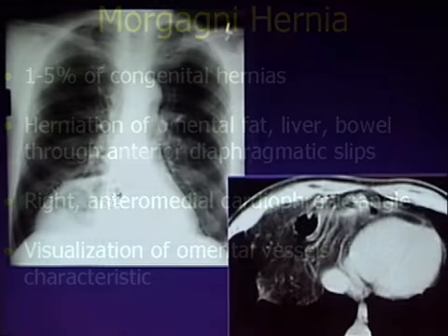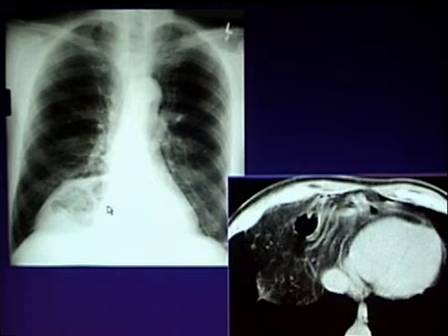So in this particular case, this right pericardiac mass isn't much of a diagnostic dilemma because we're aided by the presence of air in the herniated bowel loops. Would that something other than air-filled bowel loop had herniated, you would be a little bit challenged to, based on this radiograph, diagnose specifically what this represents.